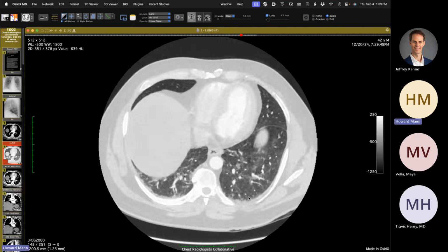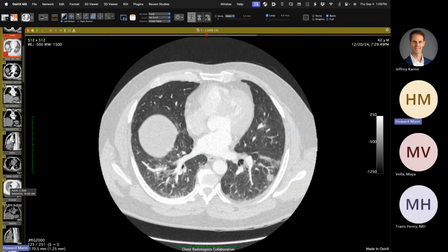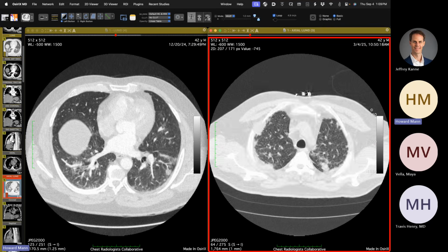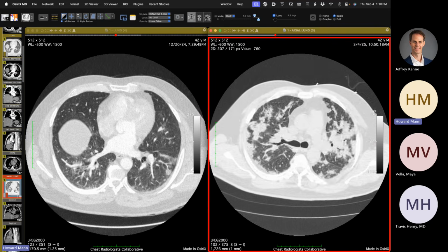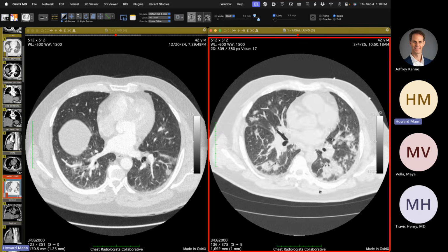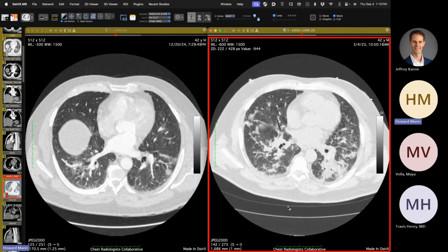at that time. I don't know how sick the patient was, but I'm going to show you some follow-ups for that. So that's in December. I'll leave that up and we go forward to March on the right-hand side. Again, we see more opacities. These are consistent with areas of consolidation, multifocal, multilobar, patchy, quite extensive here, very extensive, involving all lobes. No signs of interstitial edema, no pleural fluid, just these pulmonary opacities consistent with consolidation.